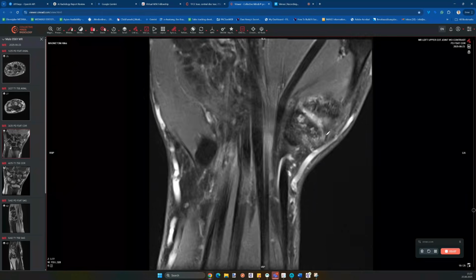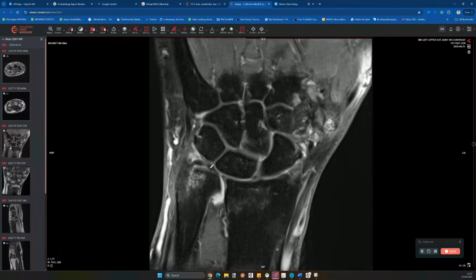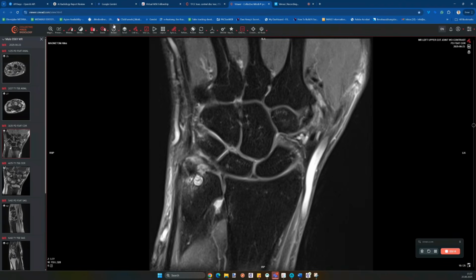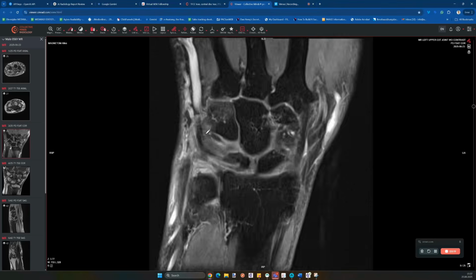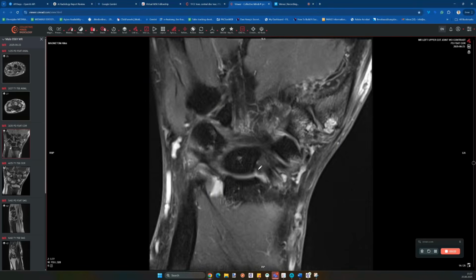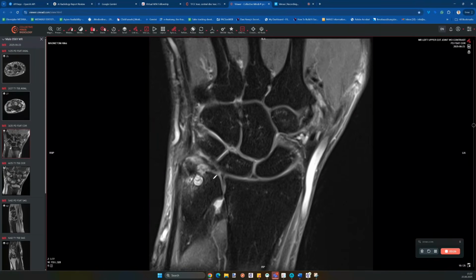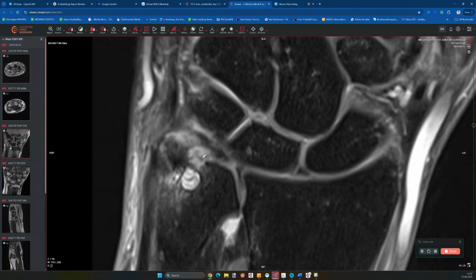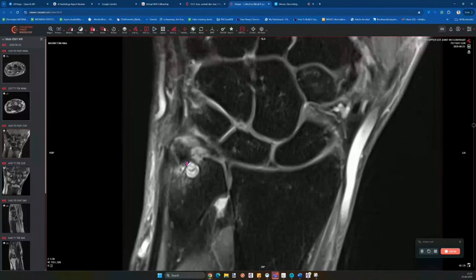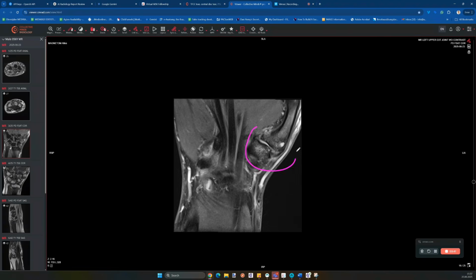Clinically, I mean, these things are probably more important: osteoarthritis, and then the changes on the ulnar carpal side here. Where are the symptoms? They even ask about these things. So most likely the patient doesn't really have much issue here in terms of the SL ligament, and the issue is the synovitis that we can see here, which then also goes into this partial tear of the foveal attachment, or even a high-grade partial tear. There may be some fibers still intact, so we just go with high-grade partial tear, intraosseous ganglion formation, perifocal edema as the main culprit, I think, in this case, in addition to this one here.